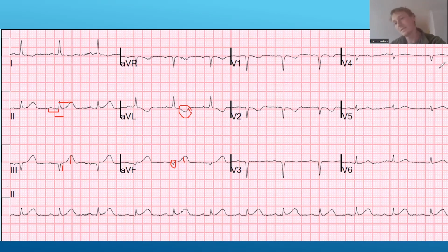Okay, and then I look at the rest of the ECG because I'm not getting too tunnel focused. AVR is fine. Normally we would see an R wave in the QRS complex in V3. We don't have that. We just have a Q wave. This is because this patient has had a previous anterior MI. Remember, like we talked about with how STEMI progresses, this is probably what's happened here. We've got T wave inversion, and we've got some changes going on here too. This is probably all non-specific.